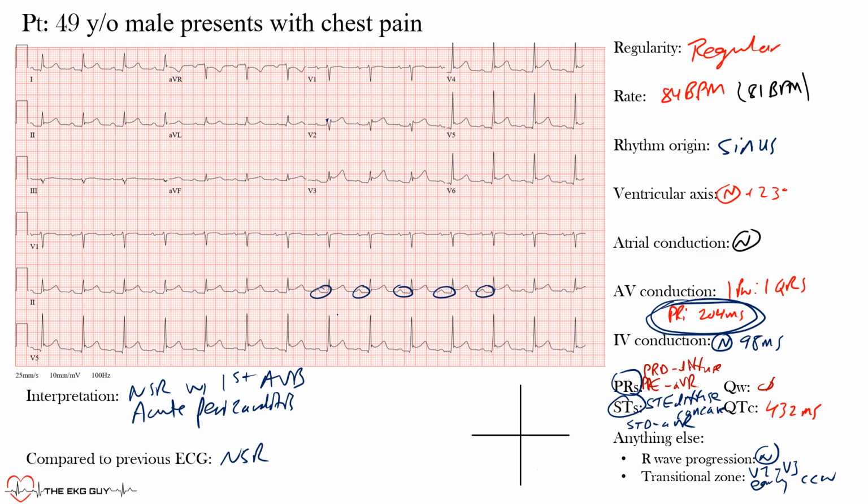Sometimes you can see them to be tachycardic, meaning they have a fast rate because of the pain. So he wasn't experiencing that. They may also have a friction rub that you hear on auscultation, and even an effusion. So we see these diffuse ST segment changes that we saw, with the concave up ST segments and depression.